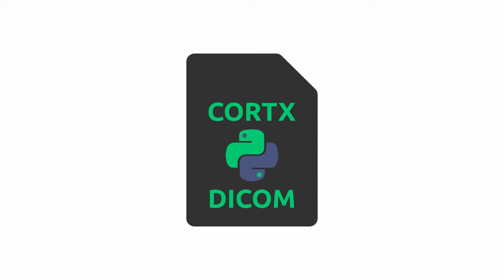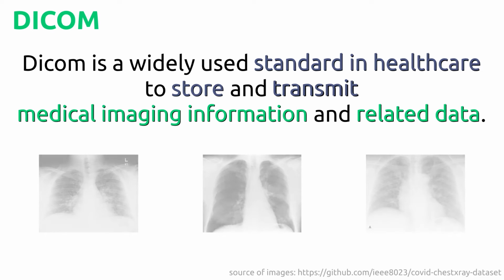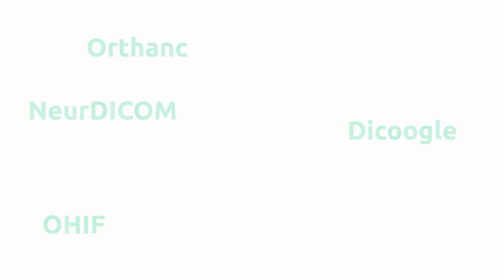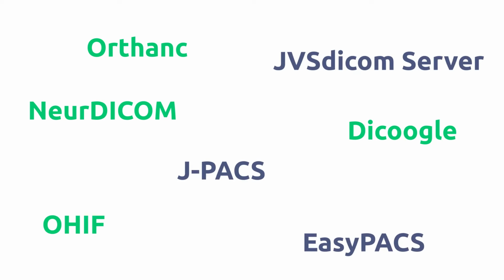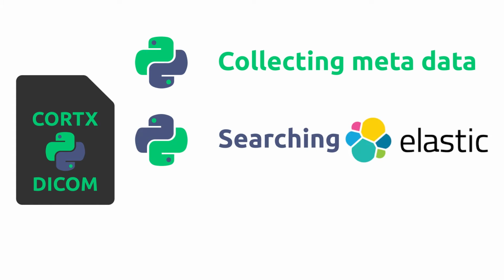This video presents our DICOM Cortx integration. DICOM is a widely used standard in healthcare to store and transmit medical imaging information and related data. There are a lot of free or paid DICOM servers or viewers, but the strength of them is storing. Our solution is focused on metadata collecting and searching with Elasticsearch integration.